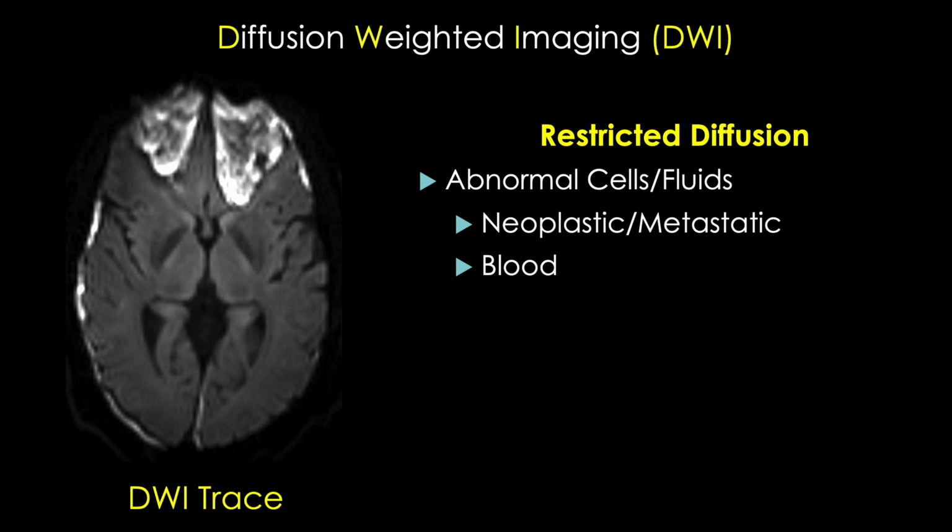In these subdural hematomas, the bar is lower. Remember that we should see no restricted diffusion here at all, as normally there's simple flowing CSF here, so any restricted diffusion within these regions is abnormal and must be explained. A few more examples to wrap up this section of the lecture.